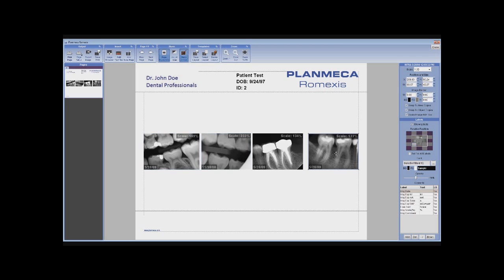Okay, so now that I've got them customized to the paper, if you like them laid out like this, that's fine. You could always stack them on top of each other, so any which way you would like to do this. So everything's the same. So when you're customizing the labels, I'm going to first select this first image. I'm going to make sure I set for all labels. I can adjust the font size, bold or not bold, italic or not, background, foreground color, opacity. We have the labels below.